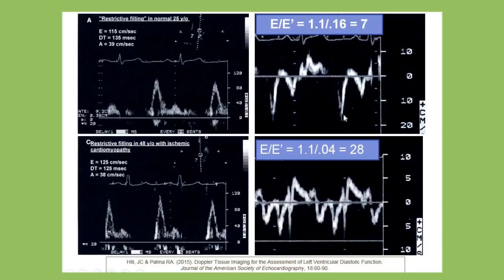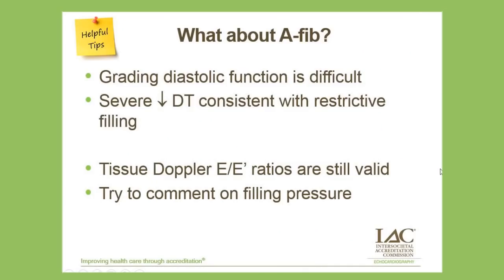So this proves my point, I think, that myocardial relaxation is abnormal in all patients with diastolic dysfunction, because you do not see a normal pattern in the tissue Doppler, where you do with a patient that has normal diastolic function.